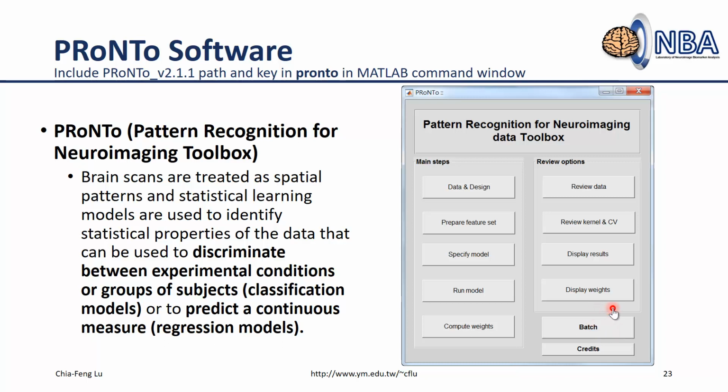Again, today we only have one dataset, so I'm not going to tell you how to use the batch. You can just read their manual and follow the steps, and you can easily find out how to do so. But today I'm going to give you a walkthrough introduction about how to do the analysis right here.